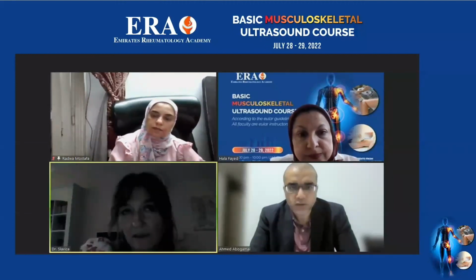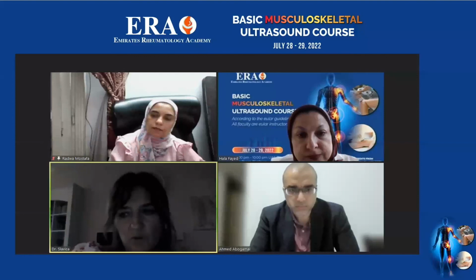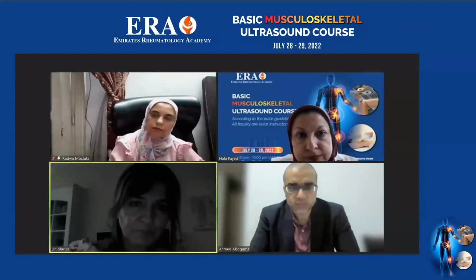I mean, enthesitis, calcification and bone irregularity, not bursitis. Okay. But sometimes we also have bursitis as well.